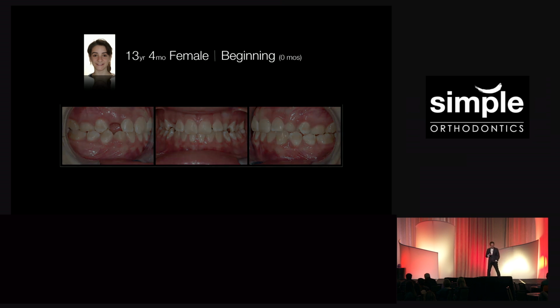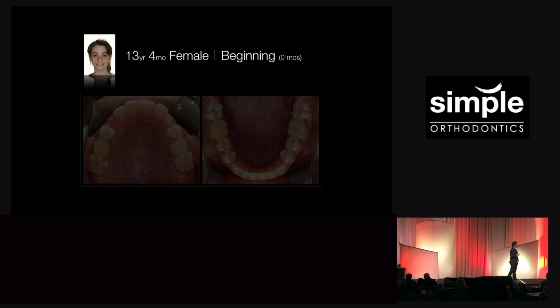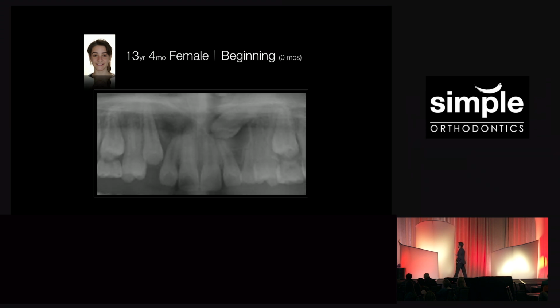And Jessie came to me about 13 and a half years old. The dentist sent her over because the upper left canine hadn't exfoliated yet. And they took a panoramic image and started scratching their heads, saying, oh, that's why it didn't come in. So tell me what you guys think of that upper left canine. Is that mesial, is that lingual or buccal?